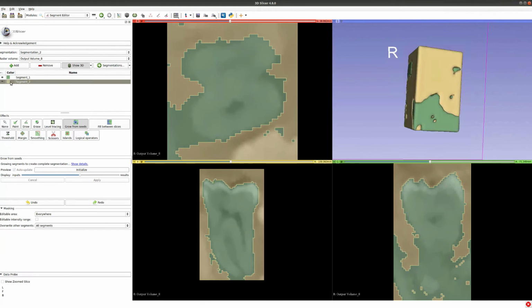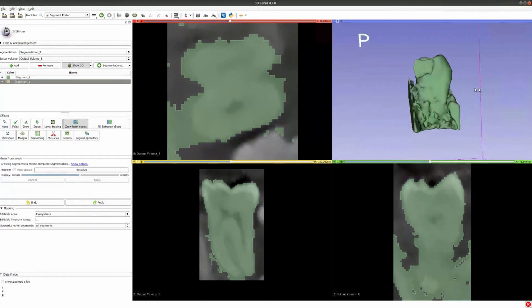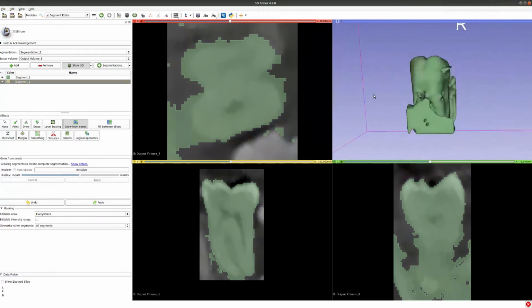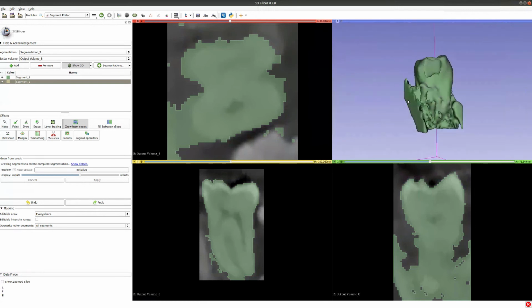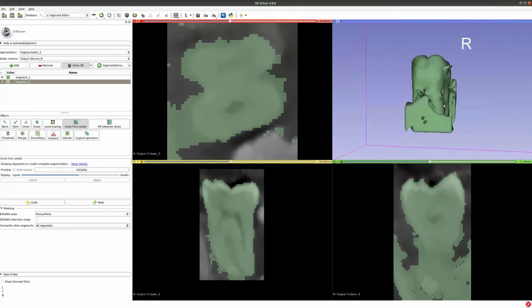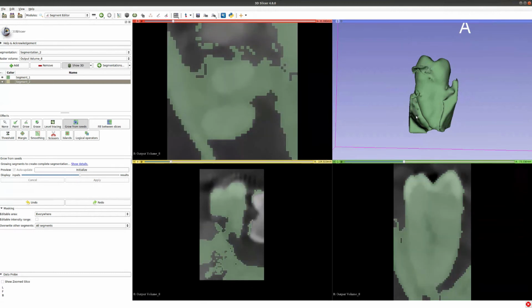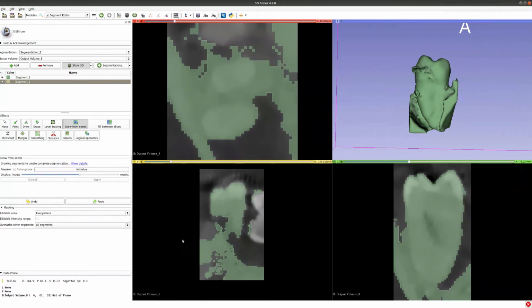And if we look here in 3D, we can just remove this here. So again, some places it went okay, but the idea is now to simply go over some of the slices where it performed really bad, and put whatever it did, put here in this tooth segment, as the background instead, manually do that. So if we click here, shift, then we can see there's a lot going on here, which was highlighted as tooth, which should not be tooth.